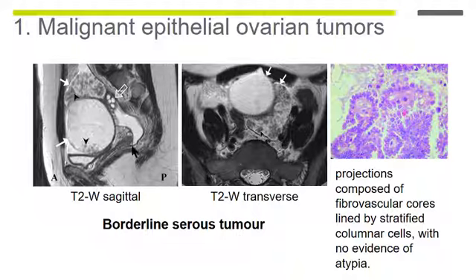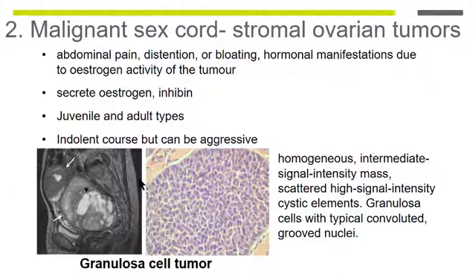The only way to really recognize them is that they have fewer, often smaller nodules, as in this stippled appearance in this borderline tumor, but they can be spread all over the peritoneum, and they can be recurrent. So if in doubt, always call it a malignant tumor rather than a borderline tumor, unless you're sure or there are just very few nodules. Okay, so that's the malignant epithelial.